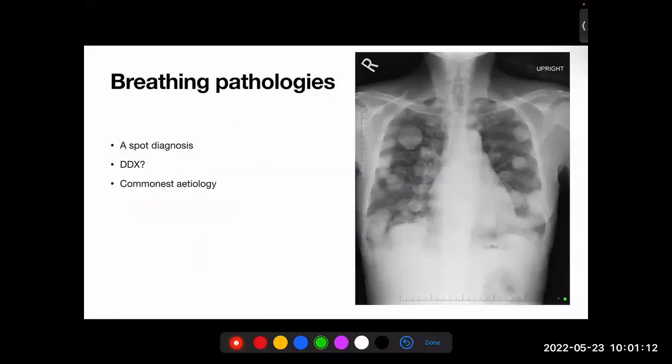I'm not saying anything. Cannonball metastasis. These are mets. Oh, there are people who have built this thing. My slides, I think they leaked before.